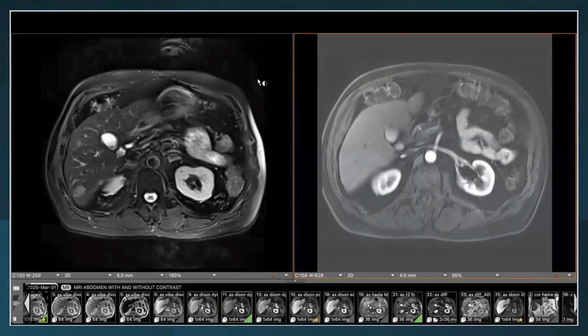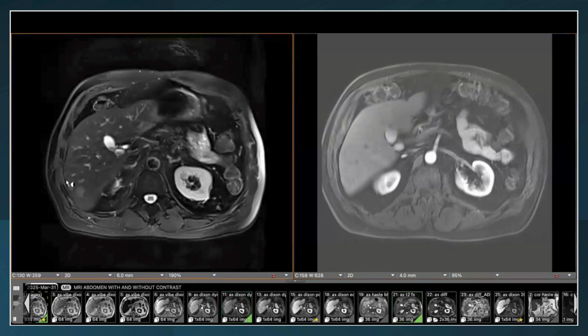As we start thinking about liver imaging in this patient with neuroendocrine tumor, the first thing that we're going to do is take a look at our T2 weighted images. In the prior case, I talked to you a little bit about the stealthy appearance of focal nodular hyperplasia. I want you to compare and contrast that appearance with the appearance of metastatic disease. This lesion has a T2 gray or a tumoral gray or an intermediate T2 signal, as does its adjacent lesion. These findings are much more suspicious for metastatic disease and really raise my level of concern when I take a look at this.